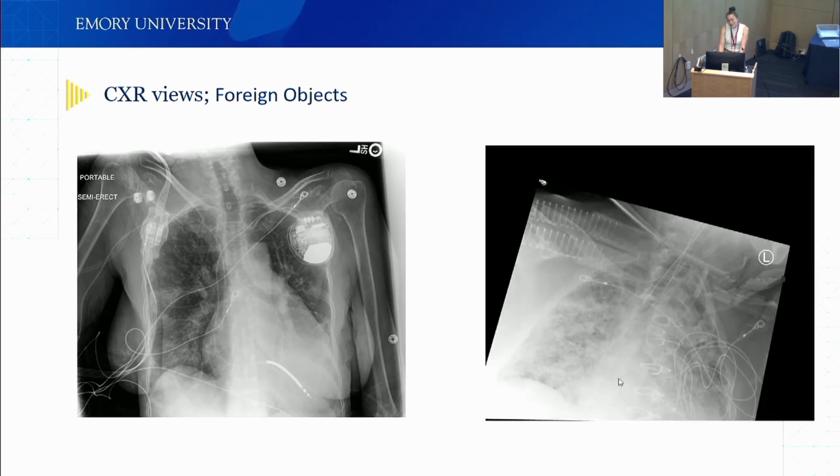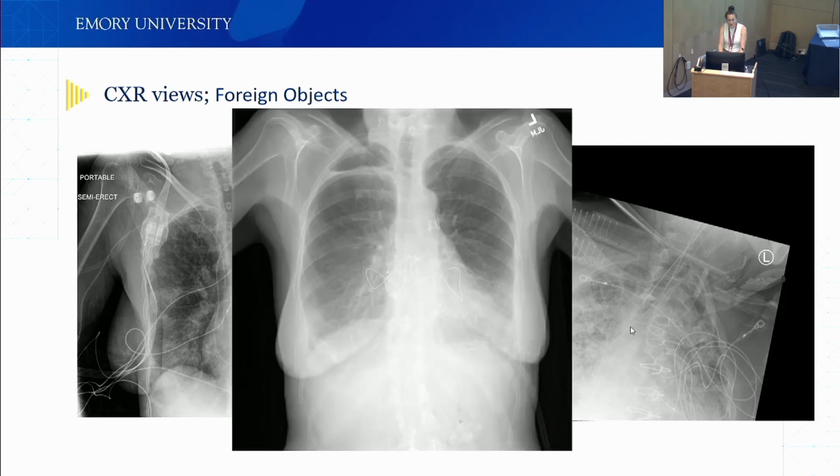Same if you're predicting lung disease. I mean, we can all tell this patient's lungs, they're here. They're not filled with air. But we can also see that there's a lot of wires. There are sternal wires here, and these are the ventilation tubes that go to the machine. So there's a lot of other things that your AI can focus on besides these lung fields.